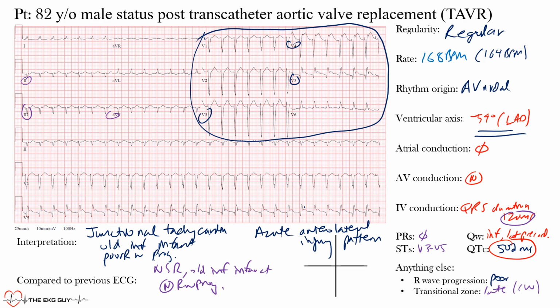And he ended up doing well, had to go on some CVVH and some dialysis for some time, but eventually had a great renal recovery and is doing well now. So this is quite a fascinating thing. His EKG afterwards actually did improve a bit, and he got better R wave progression here.